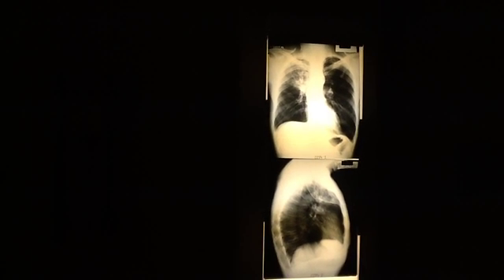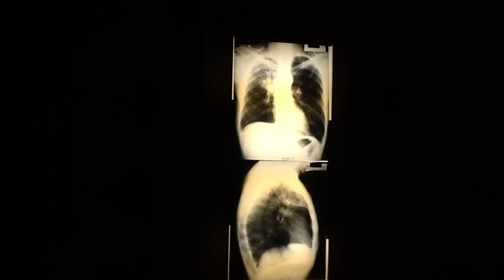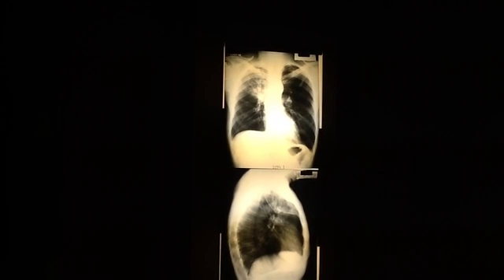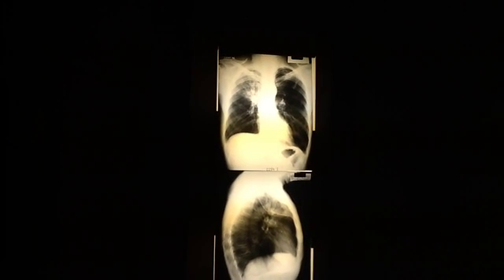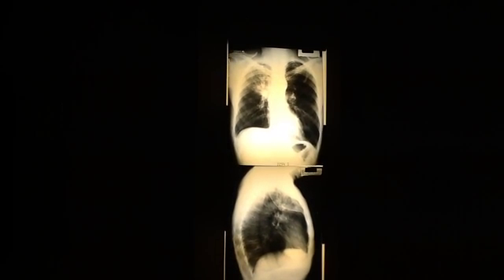Tell me what you think of that one. The right hilus is higher than the left and enlarged. Okay. Well, let's look firstly at the lung. Any density change? Yes. Okay. What kind of a distribution? Lobar, right upper lobe.